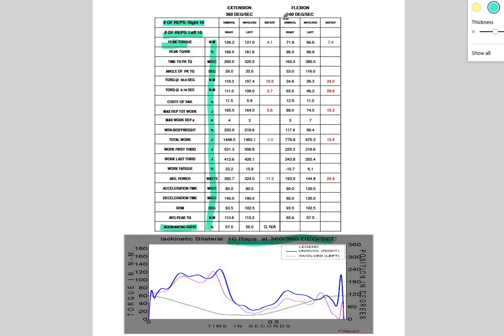So below that then, if you take everything to, and I'm going to try and draw this as straight as I can, but I'm failing terribly, to the left of the line that I've just drawn, and to the right of the units of measurement here, then these three columns all relate to the extension movement that was performed. So you have the uninvolved and the involved limb. Now, as we've already discussed, involved and uninvolved can mean different things.